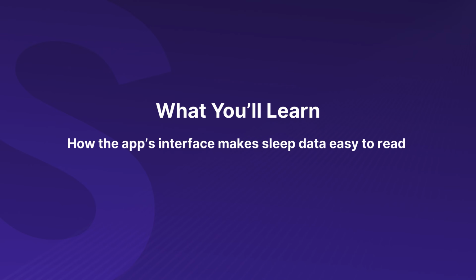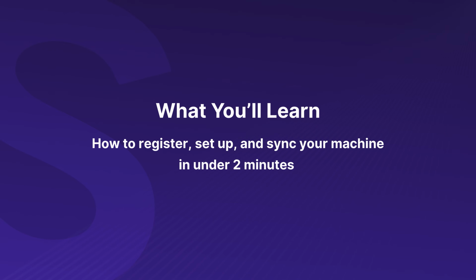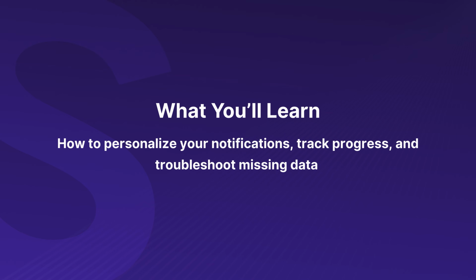How the app's interface makes sleep data easy to read. How to register, set up, and sync your machine in under 2 minutes. What every screen and score actually means. And how to personalize your notifications, track progress, and troubleshoot missing data.